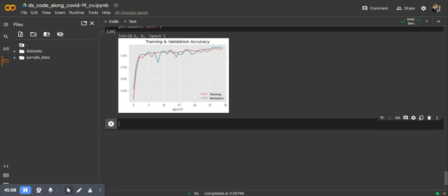So the accuracy is increasing as the training goes on over the epochs, and when we get to the end, we're looking at what, 97, 98 maybe for our validation. So it's a pretty good model, but we still need to let it predict on unseen data, which we'll do in a moment. But first, let's just get the figures for it.